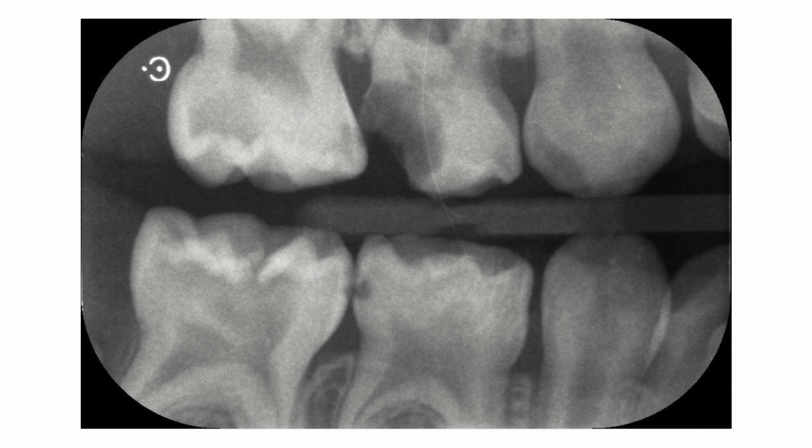So this is a right bite wing, and in terms of the teeth present, we've got an E, D and a C. So they're on the right, so we've got the 5-5, the 5-4, 5-3, and then on the lower we've got the 8-3, 8-4, 8-5. Now, in terms of bone levels, this is a child. There's no evidence of sixes yet. So this child is 5, maybe 6 years old.